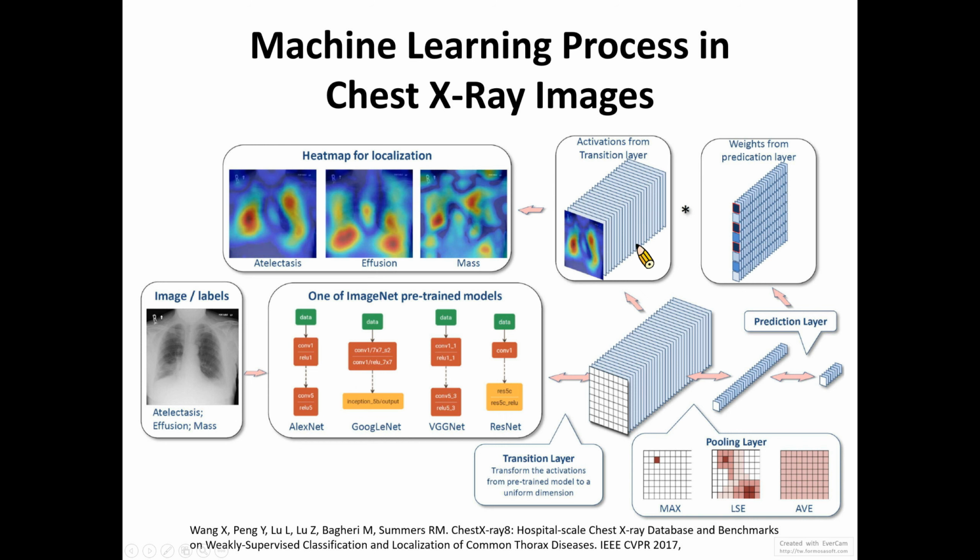The idea of transfer learning is that you can load a pre-trained network and replace the final layers corresponding to your data. Then you can use this modified network to do the training on your data.